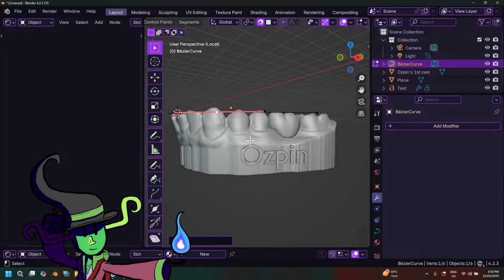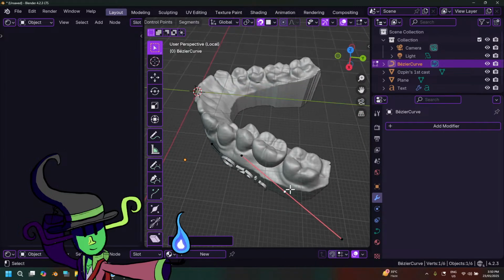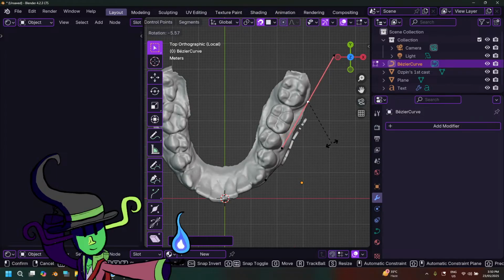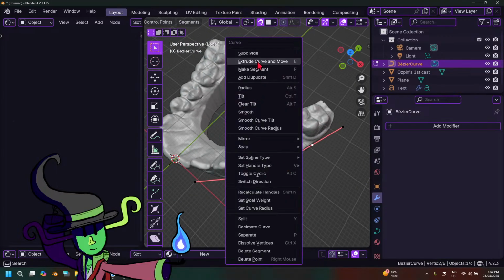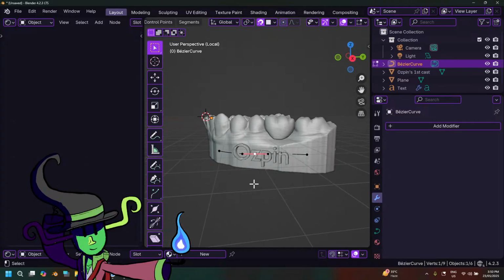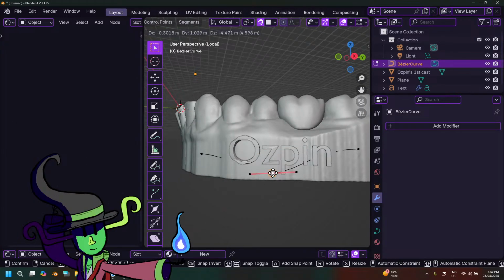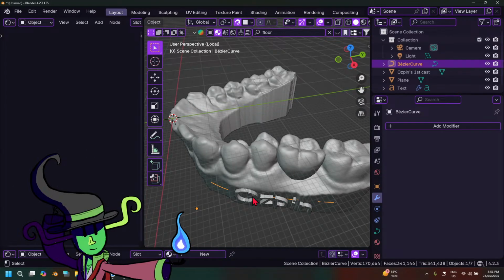I don't think I would really suggest dentists use Blender because of how complicated the user interface may be. But hey, if you're willing to give time to this one program, keep in mind that this is gonna happen to you, most likely.